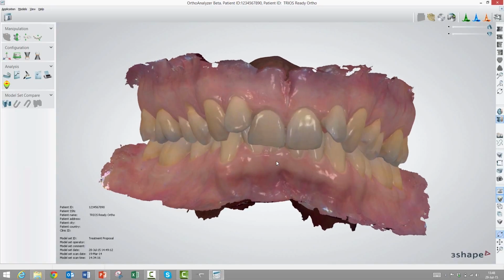As you can see here, it returns to normal. And as we covered the last 3 when we talked about the mouse, I'm actually through explaining to you what all these 25 tools are doing. So the final thing I want to show you in this video is how you configure the toolbars, and it is very, very, very easy.